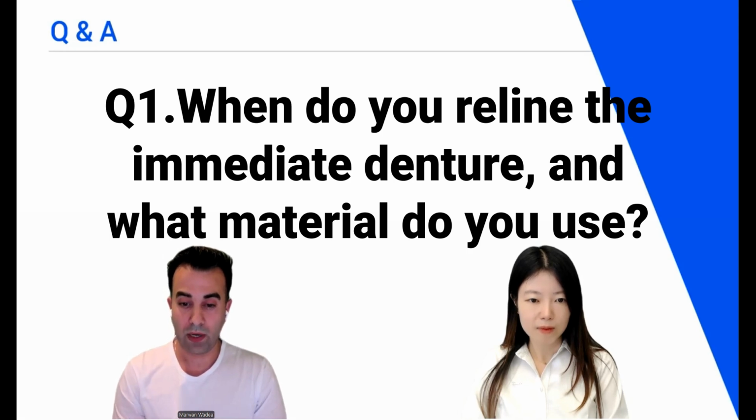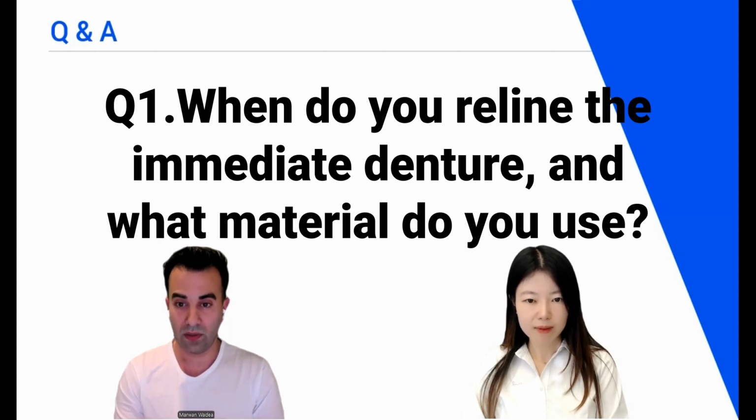So it's a work in progress. It's not a final product. Even if the patient down the line wants to move towards something more definitive, like implant retention, we can still convert that denture, whether chairside or using the lab, because this denture will act as a foundation for our future work. If we are happy with the smile and the patient is comfortable with the bite, we preserve it. We tend not to lose it, using the digital tool.